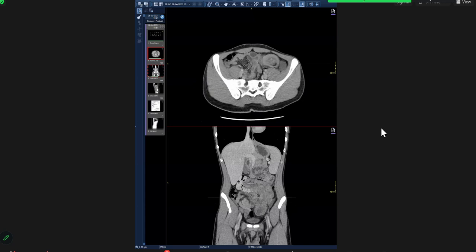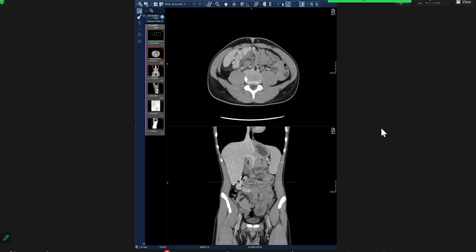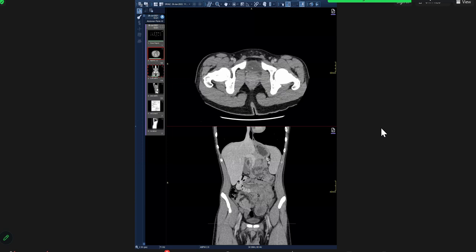And then it's causing an intussusception. All intussusceptions do not need surgery. You have to remember this. There are some that are transient. Those are the ones that are less than 3 centimeters. You see them and they go away the next time. This one, however, the patient has abdominal pain, there's inflammatory changes, and you see that there is a specific abnormality at the lead. So this tubular structure needs surgical management, so you have to say surgical consult because then they will decide.